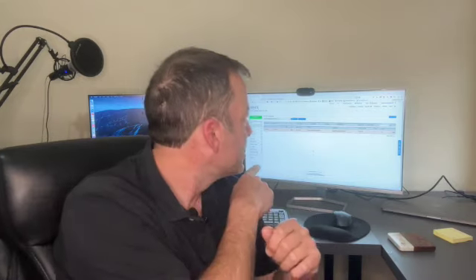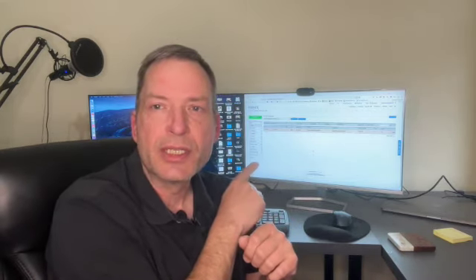Let me walk you through it now. This is my sample doctor account, so this is exactly what you'll see. I'd be more than happy to stop by at your office to help you get it set up and to help you make the transition to EasyRx. It's pretty simple, but if you need me to, I'd be more than happy to. So let's jump on in.